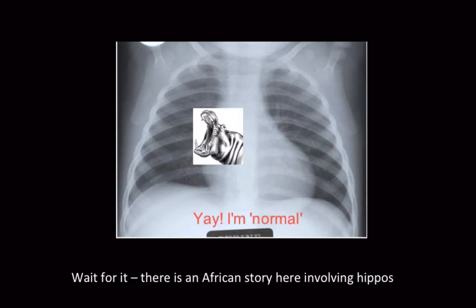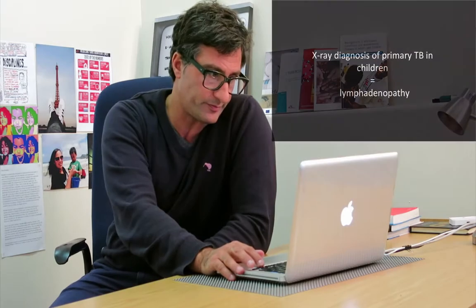You note that that's an open mouth of a hippopotamus, sticking to the African theme. That represents the vessels at a hilum. It's a really important part of this lecture because that's where lymphadenopathy occurs, and that's where you hope to pick up TB lymphadenopathy and make your diagnosis. So just have another look. The vessels meeting at the hilum should be like the open mouth of a hippopotamus. Same for the other side, but you'll see that the hippopotamus will be hidden by the heart shadow, so not so easy on the left.